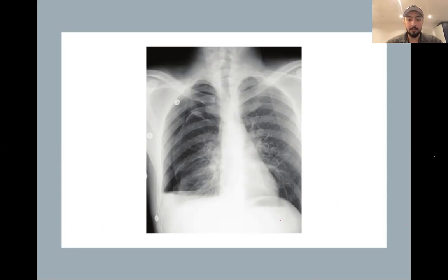So this is a characteristic finding of hemopneumothorax, because the fluid level is flat. It's not curved like you see before. So it's very flat, unlike the meniscus sign, which was curved. So if you see this sign, this is most likely hemopneumothorax, yeah?